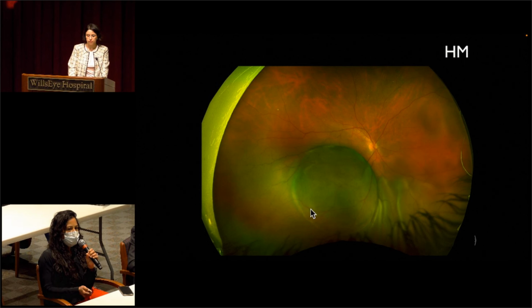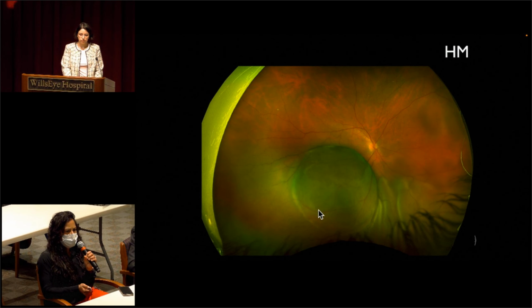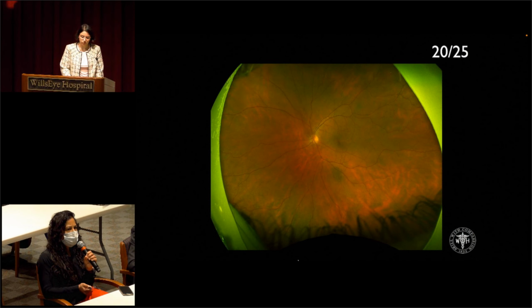And then we see these overlying retinal folds adjacent to this large mass. I don't see any hemorrhages or any exudates.